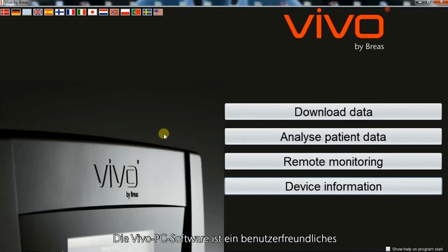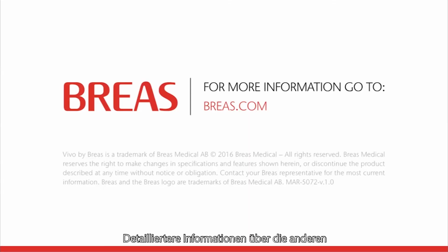So as you've seen, the Vivo PC software is an easy-to-use tool to retrieve information from the Vivo ventilators as well as remotely monitor your patients. More detailed information on the different features can be found in the other videos in this series, on our Breas.com website, or by contacting your local Breas representative.